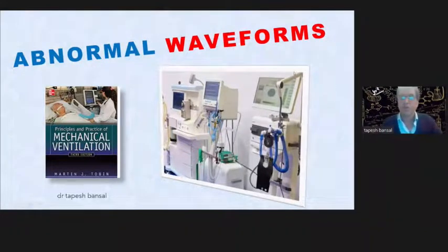So I'll just run you through some abnormal waveforms. Please be aware of one thing, that different ventilators have different software, and the kind of numbers and settings may vary a little from one ventilator to another. So if you are working in an ICU for 5 years with a particular ventilator, and somebody else starts talking about ventilation and he's using another ventilator, there might be a slight mismatch in the type of numbers and settings that the other person is talking about, and you should be aware there is a difference in the software of each ventilator type.